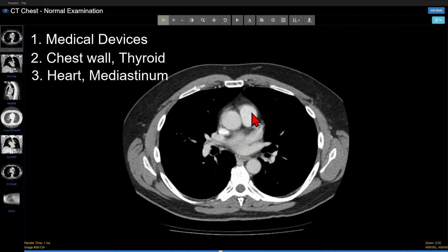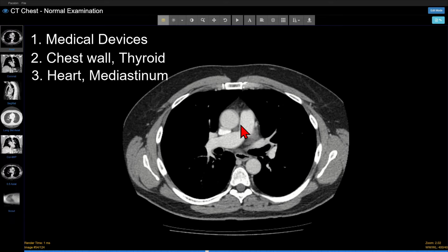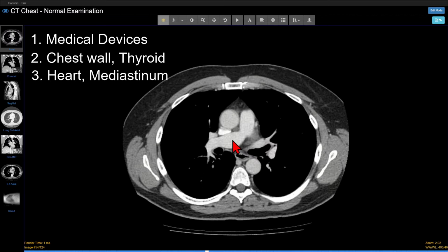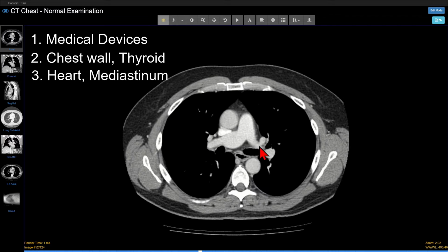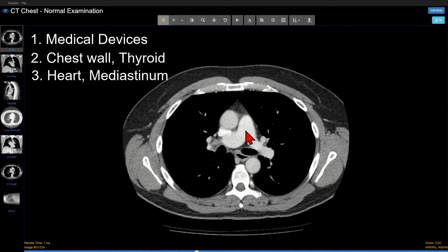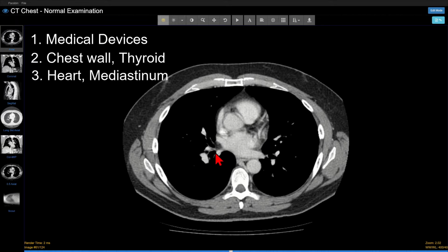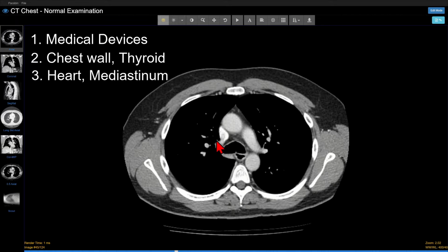Starting with the pulmonary artery, I usually measure the pulmonary artery here in this axis. The pulmonary trunk is considered enlarged if it's over 3 centimeters, which would also indicate pulmonary hypertension. I also then follow the pulmonary arteries themselves when we give an IV contrast, even if it's a routine CT like this, because we'll often pick up on incidental pulmonary emboli.